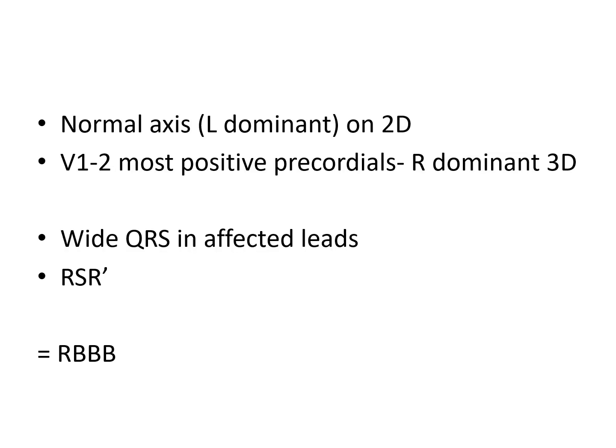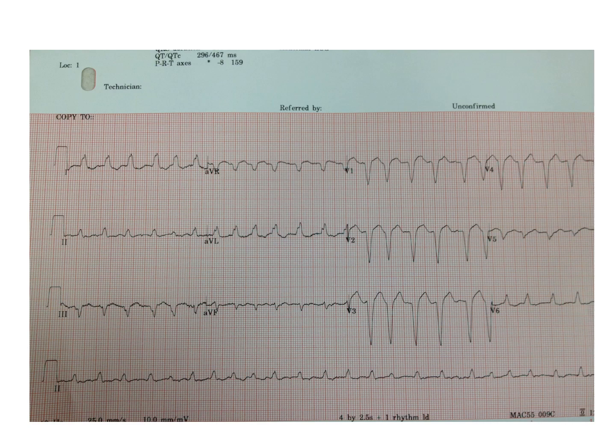So again, explanation as to the why. And finally, we look at this EKG. Lead 1 is positive, so it's going leftwards. aVL is bigger than 2, so it's going upwards. aVF is almost isoelectric, so again, it's leftwards and just above the horizon.